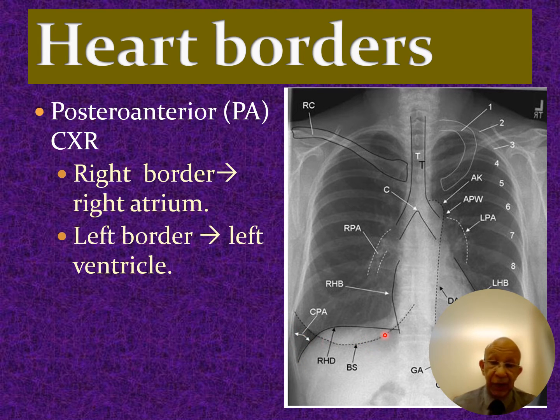Now, the right hemidiaphragm is actually higher than the left hemidiaphragm. The left hilum, on the other hand, is higher than the right hilum. So these are important rules that you should really be aware of. Behind here is the gastric air bubble, and it's on the left side, and it sits immediately below the left hemidiaphragm. There might be a colonic air bubble here.